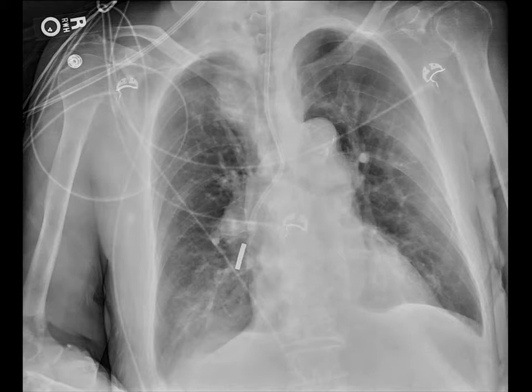This is a chest x-ray that should make you feel really nervous about not getting a chest film when you place either an NG tube or a Dobhoff. Of course, we can see a Dobhoff here, and it seems to overlie the trachea. We can't really see the esophagus, can't confirm that it's in one or the other until we see the tip terminate in the lung field. You would definitely not want to use this tube for a feed. It could be catastrophic, and I hope that this kind of scares you, so that any time you ever place a Dobhoff or an NG tube, you have to see the chest film before you start the feed.